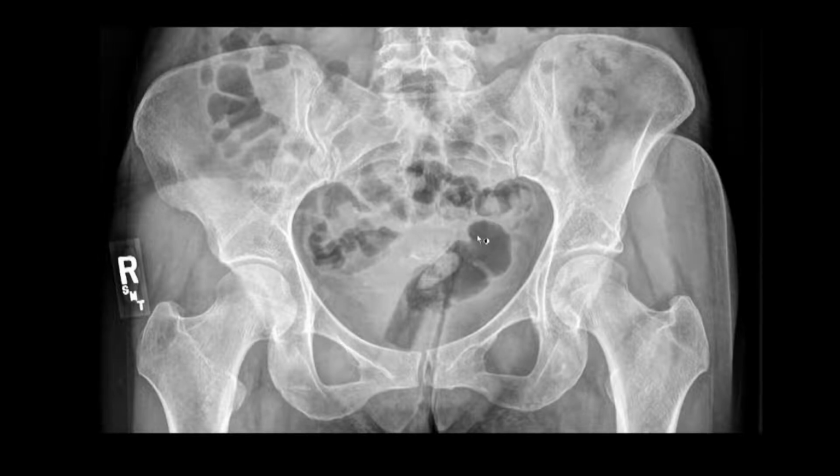That being said, we should be assessing the sacral foraminal or arcuate lines on every pelvic radiograph. These foraminal lines reflect the superior margin of the ventral sacral foramina. Any asymmetry is suspicious for fracture and raises concern for pelvic ring injury.